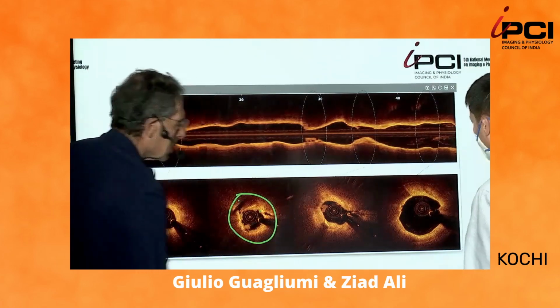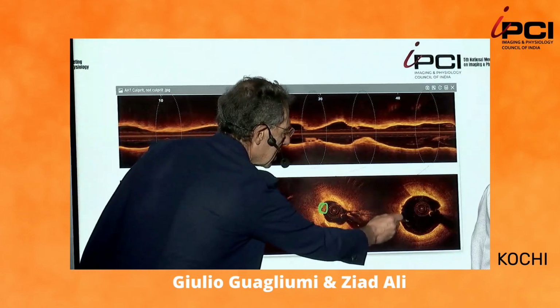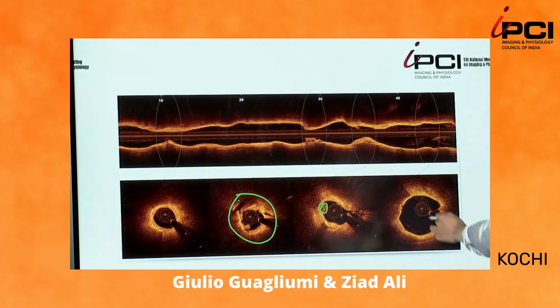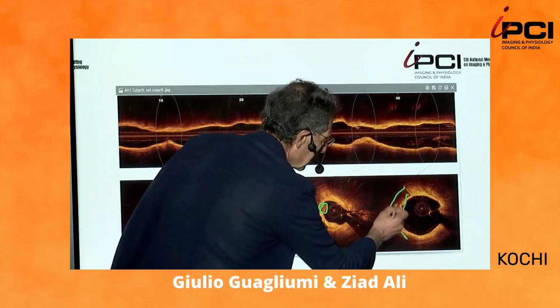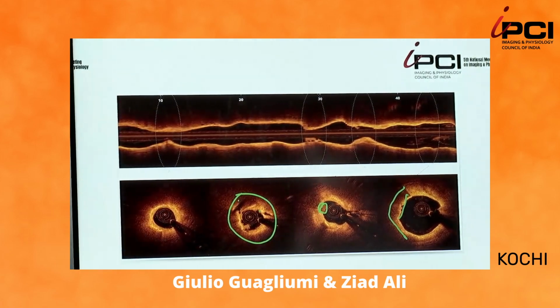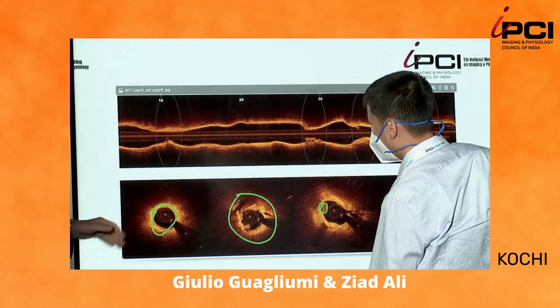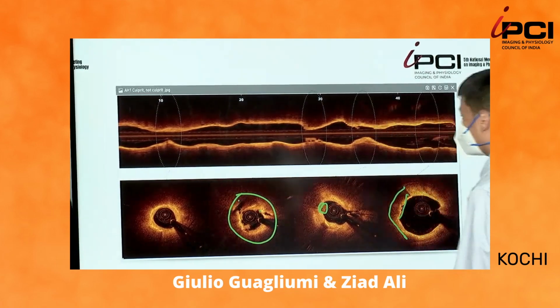What about this one? Okay. What about this one? Can you land safely or not here? Thin cap. Thin cap means thin cap here, and you can measure, of course. What about this one? This is fibrous? No.